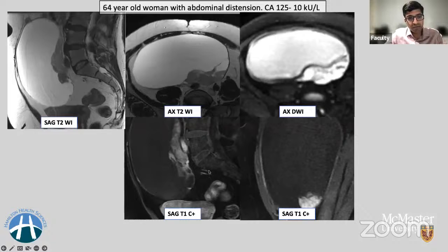So this is a sagittal post-contrast T1 image. It shows you that that's the myometrium here. Those are enhancing solid components. And one portion of the solid component was actually quite hyperintense on the T1 post-contrast phase. And when I put an ROI, this component is almost having a signal intensity of 1300 versus myometrium of just 1000. So it shows that there is enhancement greater than myometrium.